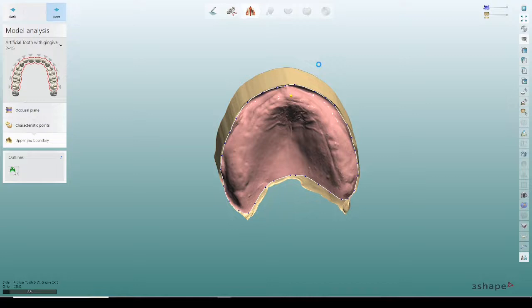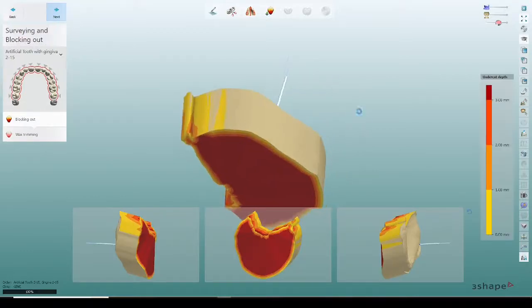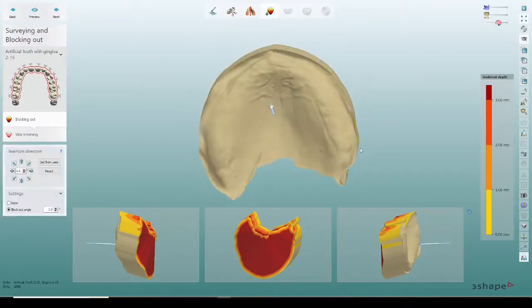And next step is going to be, if I'm not mistaken, the actual library that I'm going to choose. And as I said, we're going to be choosing the Vita library. And what it allows me to do down the line is to convert this either by hand into an analog denture, or if I'm doing a digital, but I had to choose not a monoblock. If I wanted to do a digital version of that, I would have had to choose like denture base with manual tooth reduction. But here I just chose monoblock.